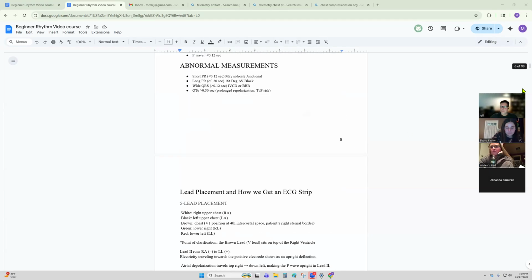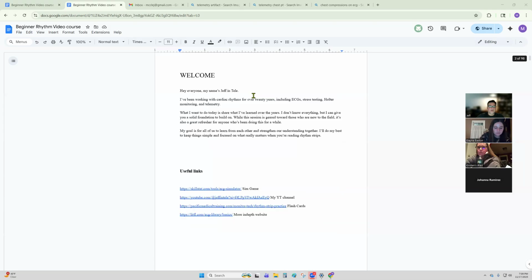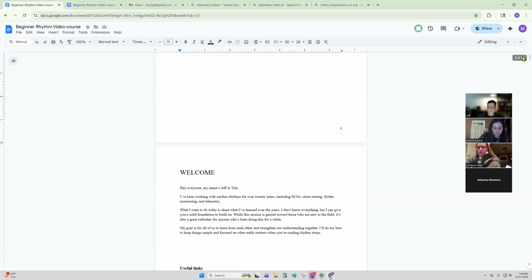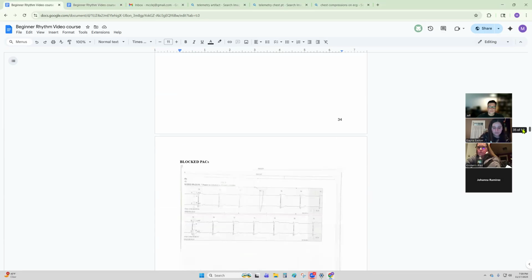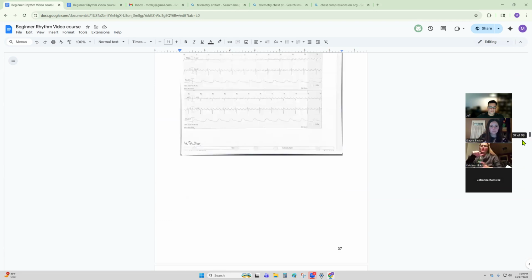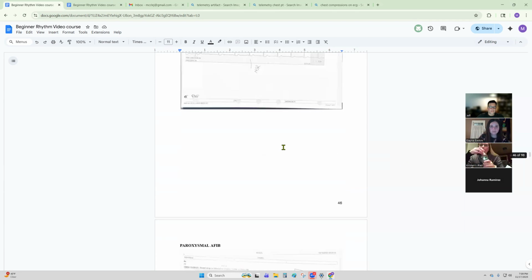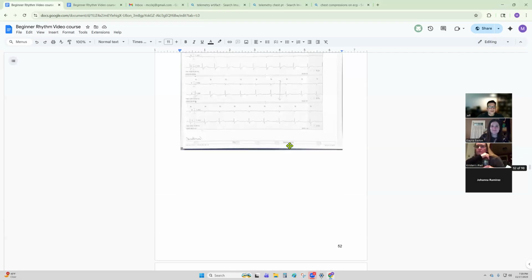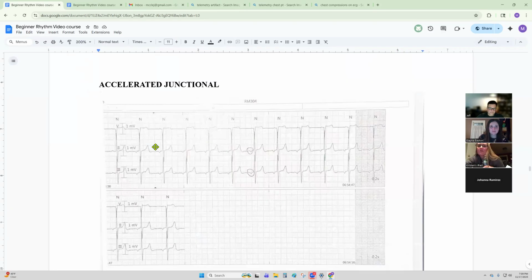So if we find some junctional P waves here, let's see that up there. Sorry, can't find the junctional stuff. Okay, close enough. Let's go this guy.